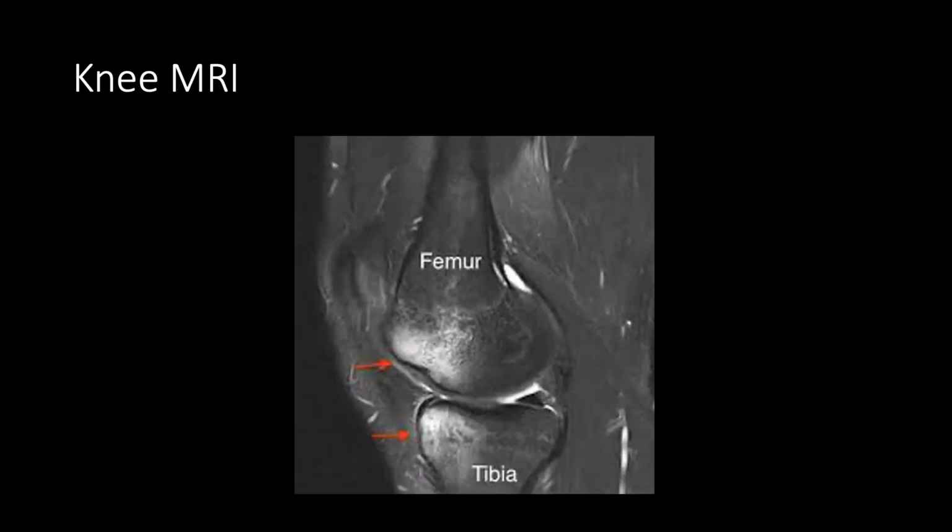All right, this will be a short talk on knee MRI anatomy. So we're looking here primarily at the femur and tibia. You can see the joint lines. We're looking primarily at ligamentous injuries, muscle tendon injuries, meniscus components in these views.